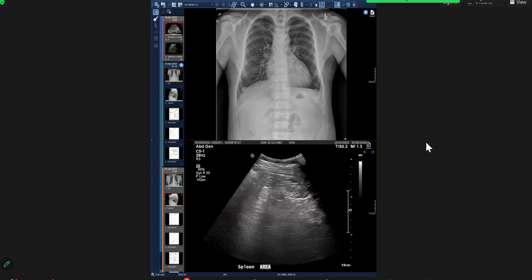And if you had started from here, you'd have spotted this at once, that the humeral head's funny. And then if you had come here, you'd have seen that the spine looks funny. So these are those films where you don't have much time, because they don't give much time to these ones.